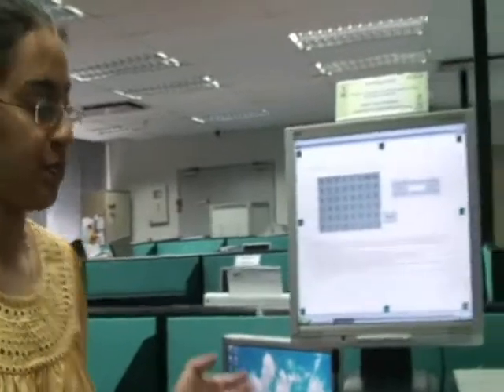This is a system we've come up with in order to aid these severely paralyzed patients in their communication process. By looking at 8 predetermined different directions, users can select different characters and therefore communicate their intentions and thoughts across. Let's have a look at the system.